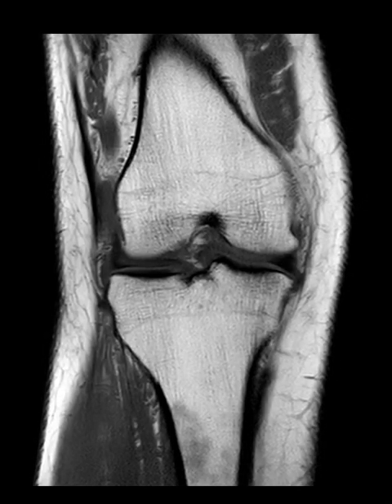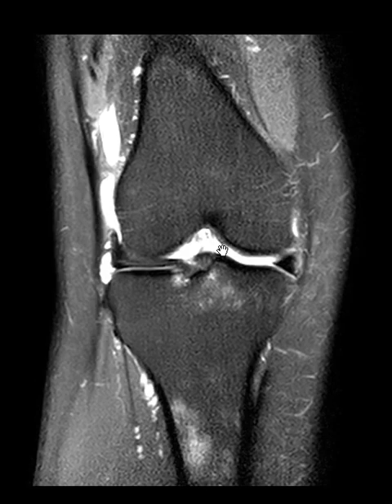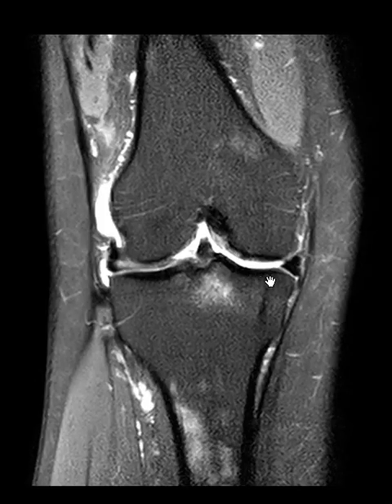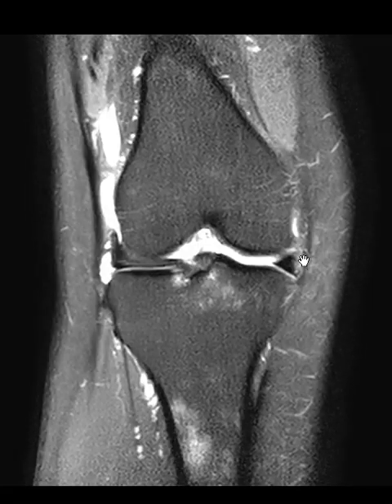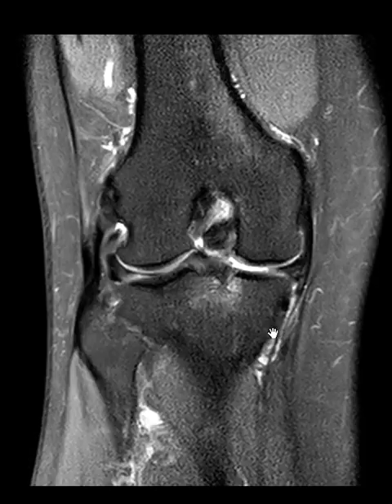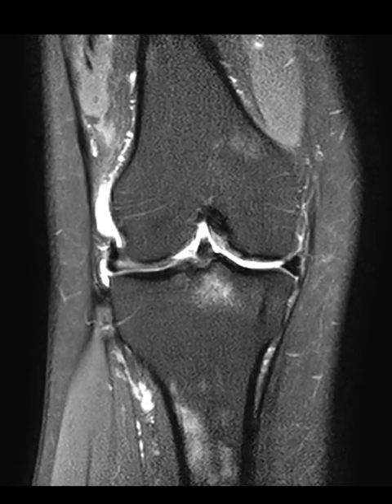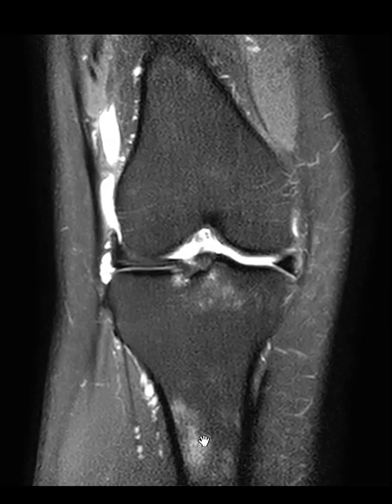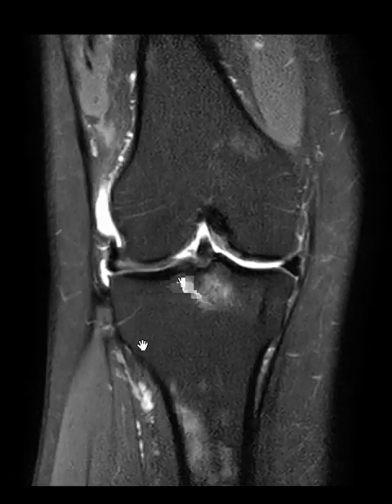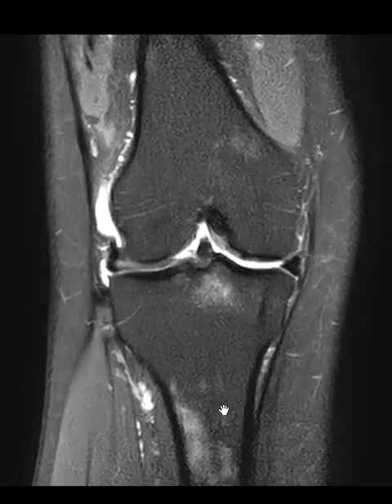This is likely benign, and correlate with history to see if they're a smoker, if they have lived in high altitude, and then throw out the remote possibility that a myeloproliferative disease is not entirely excluded, and they will have to do clinical assessment and then sometimes even blood work to make sure they don't have anemia as the underlying cause. And that's it. Thank you so much. A very common finding we see, patchy marrow, with the differential considerations listed above.